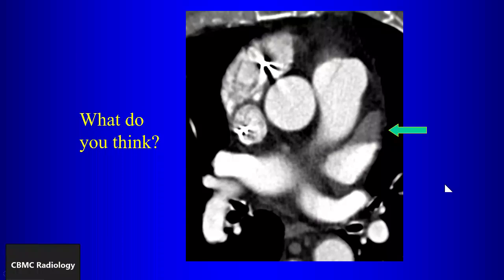So this is also associated with atrial fibrillation, slow flow within the left atrium. So you can have contrast here that is denser than the blood. So you have unopacified blood that layers on top of the contrast. So how do you prove that that's pseudothrombus? Delayed. Yeah, so you get delayed images that allows mixing of contrast here, and then that will go away.